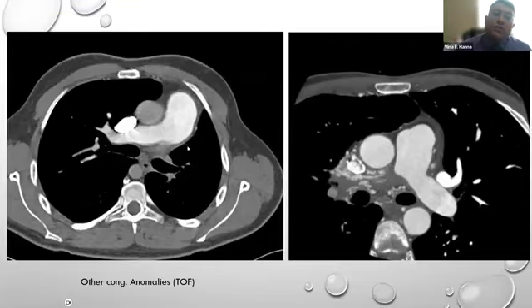This is a patient with congenital absence of one of the arteries. You see here absence of the left side. Usually the lung is small, and usually when the pulmonary artery is absent, as we see here, there are a lot of collateral vessels, mainly bronchial arteries, that become engorged, increased in size and number to try to bypass this and keep the oxygen supply to the lung and oxygen exchange between the blood and the alveoli.